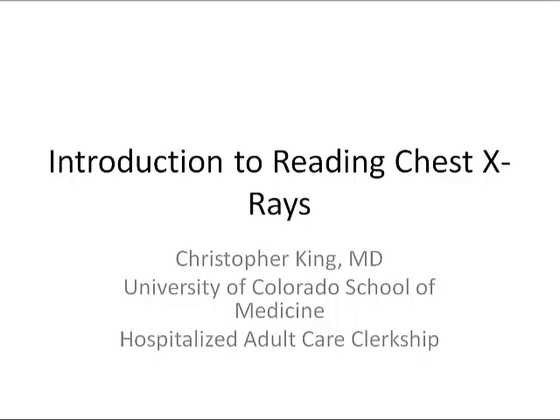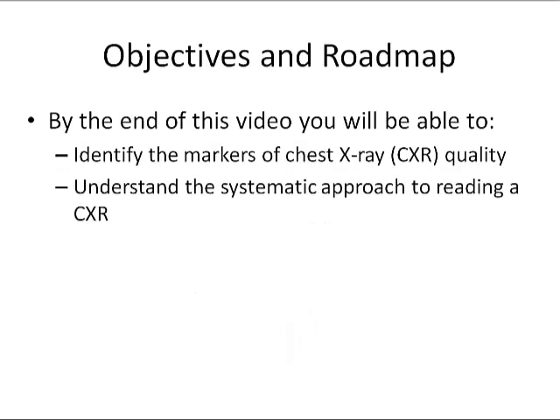This video is an introduction to reading chest x-rays, which will provide a systematic approach for you to be able to read chest x-rays, which we will then practice at orientation on Monday. The objectives of this talk are that you will be able to identify the markers of chest x-ray quality, and that you will be able to understand the systematic approach to reading a chest x-ray.